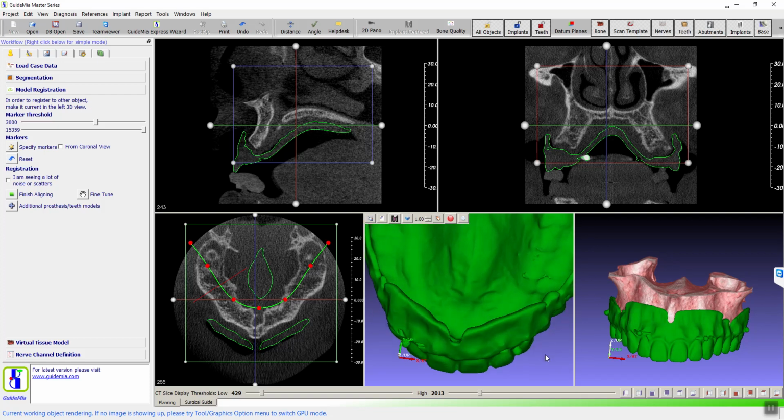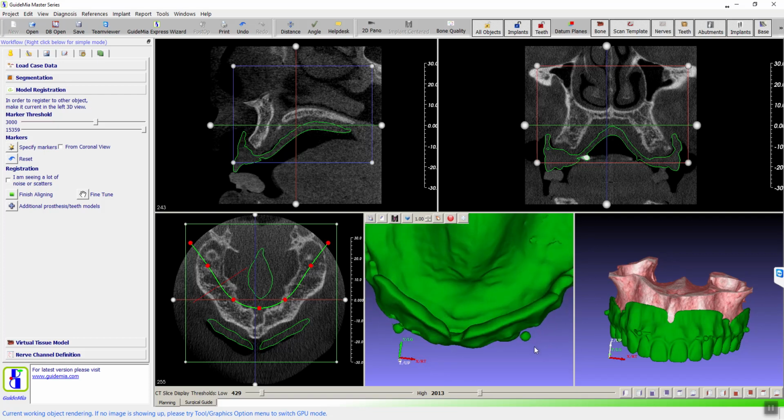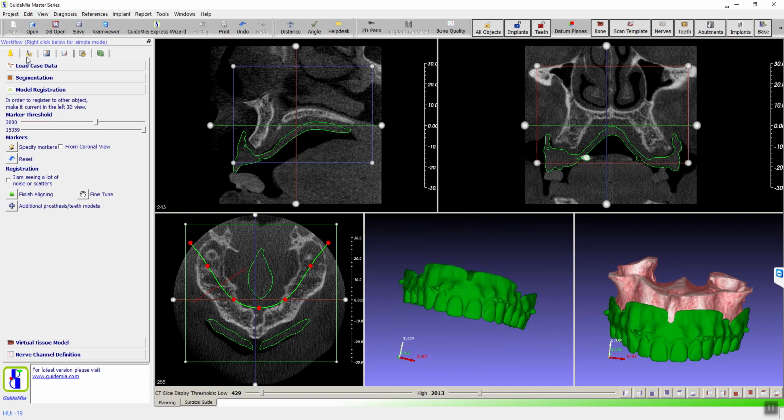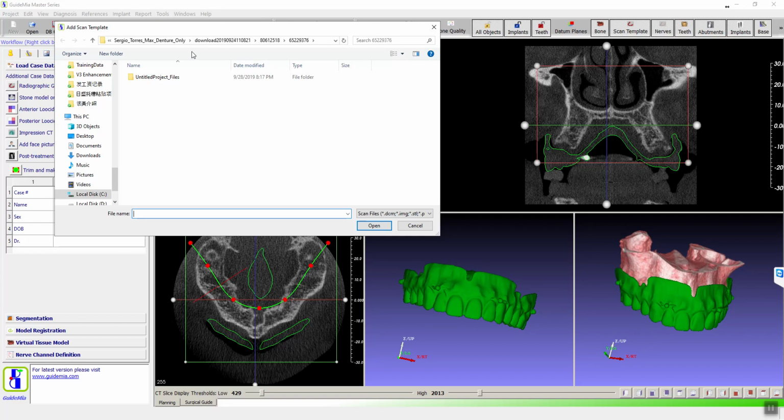And obviously, those markers could present problems for the surgical guide design. So in this case, we have the third STL file. Normally we don't, so that's fine. But since we have the STL file, I would like to add that one here.